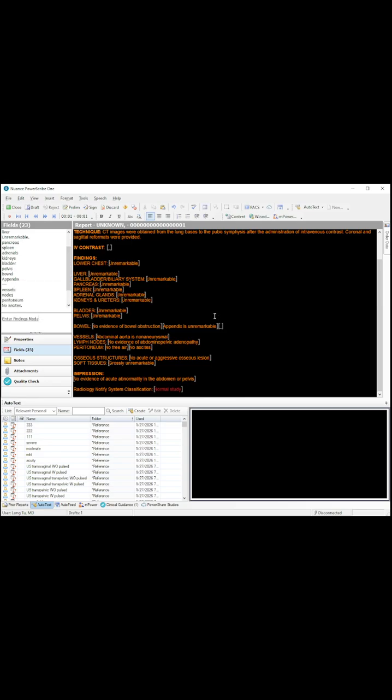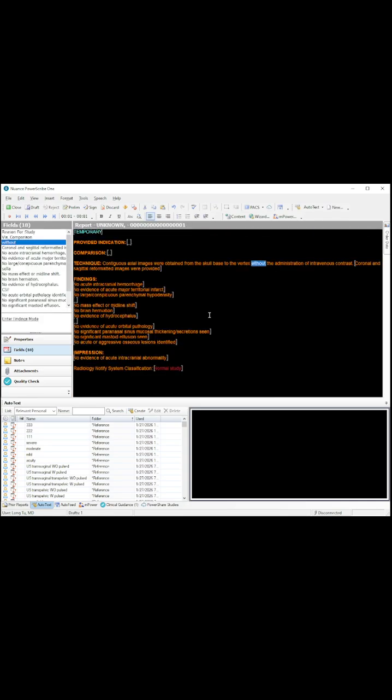And this can reduce the need to even call macros if you say something like, macro white matter disease on a brain. So let me just show you my CT head template. And that's, by the way, I just used a macro shortcut right there, typing a string. So I've got a separate teaching video about using those. So here I've got the paraventricular and subcortical white matter hypodensities. You could have something like macro white matter, or macro old brain or something to call that. But if you have it as just a pick list item, it's even easier to use.